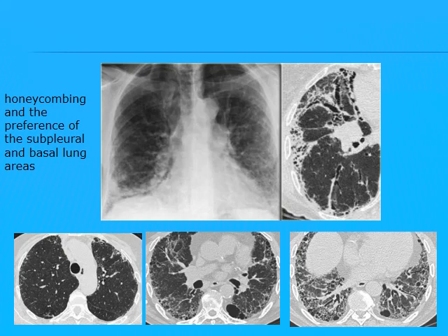Let us see. This is typical. In plain X-ray, you will see that there is a reticular pattern involving the basal and peripheral subpleural areas of the lung, and you can see shaggy border of the diaphragm and the heart. Okay, shaggy border, and you can see cystic spaces which match with honeycombing. In CT, peripheral subpleural fibrotic changes with honeycombing, traction bronchiectasis, and distortion of the lung parenchyma.